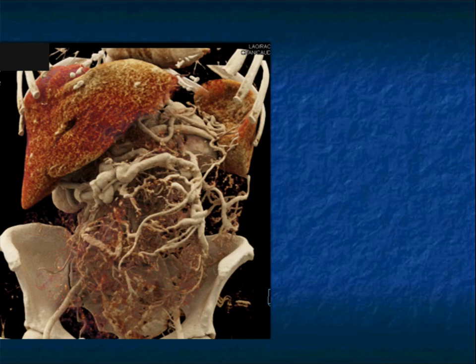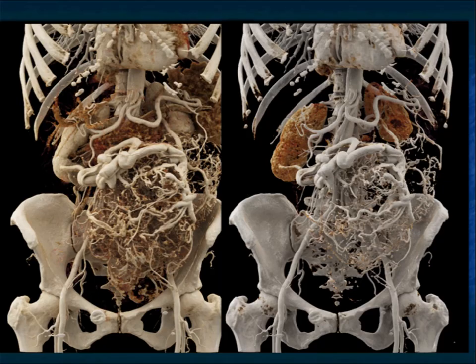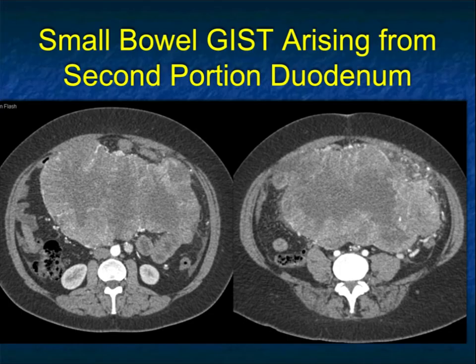We did some very impressive vascular 3D mapping for the surgeons in this case. And believe it or not, they operated successfully removing the tumor. Younger patient, they felt they can debulk it, and they were successful in part by knowing the vascular map and what was encased. Again, mentioning large GIST tumors, this looks like a big retroperitoneal mass.